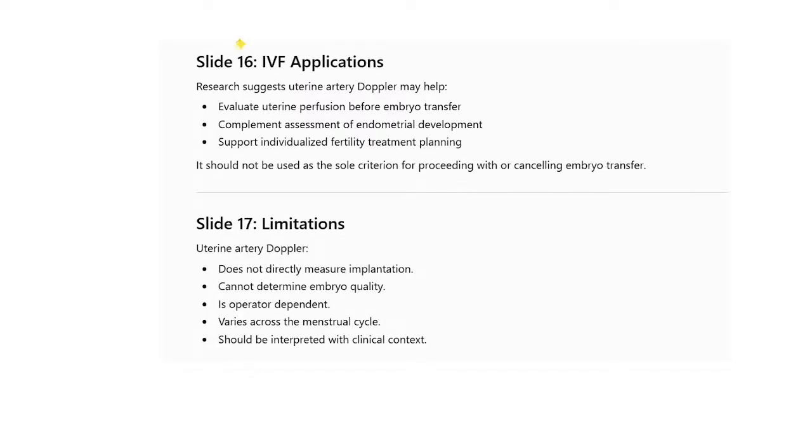IVF applications. Research suggests uterine artery Doppler may help evaluate uterine perfusion before embryo transfer. Complement assessment of endometrial development. Support individualized fertility treatment planning. It should not be used as the sole criteria for proceeding with or cancelling embryo transfer.